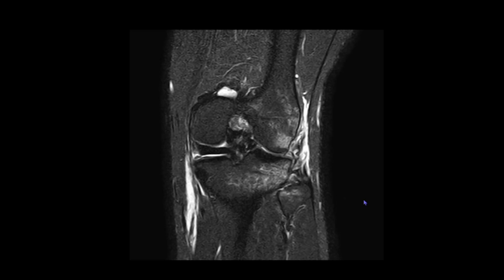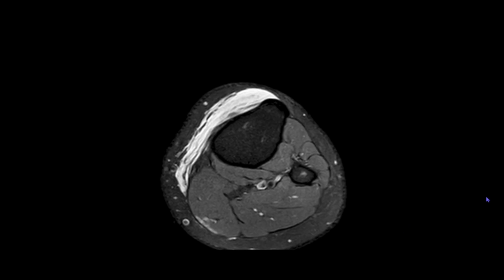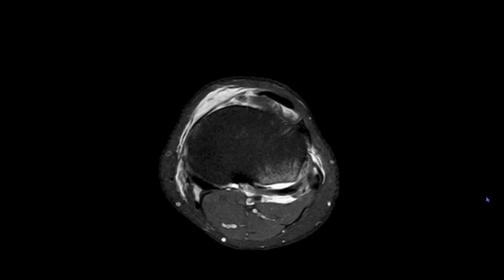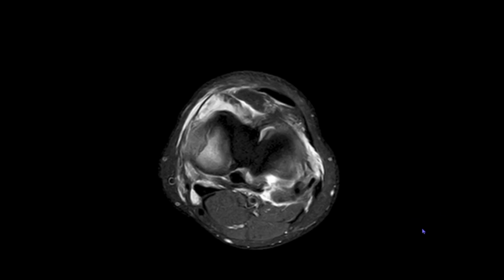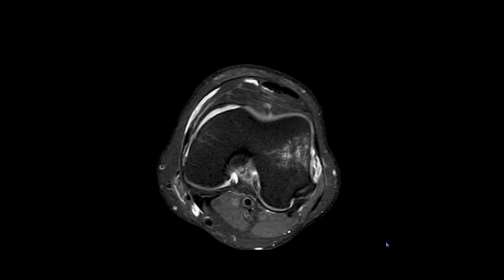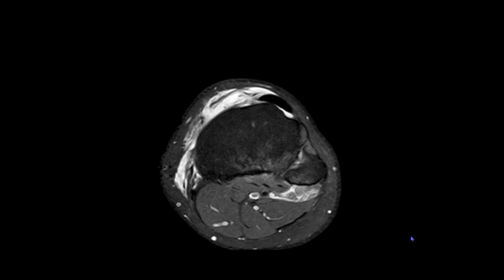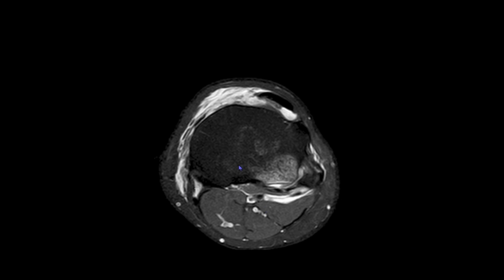So the lateral collateral ligament appears to have crumbled a bit. However, we have got the axial sections and we are able to trace the lateral collateral ligament entirely, attaching up to the lateral aspect of the femoral condyle. So we have got a large hematoma on the anteromedial aspect of the proximal tibia. So this is the region from where the avulsion has occurred.